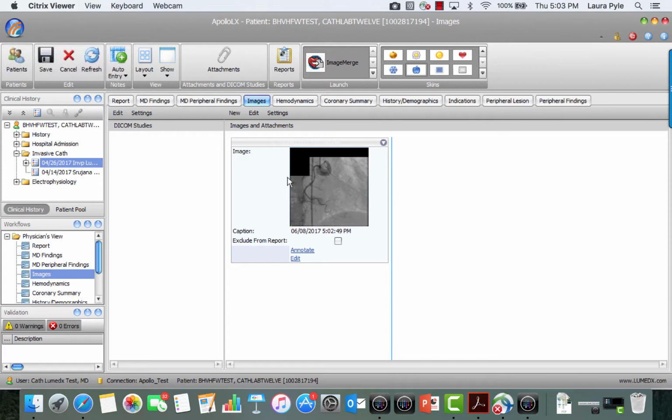As a note, any hemodynamic snapshots of pressure gradients taken during the procedure will automatically be included in the bottom of the procedure log report. DICOM or X-ray images that you have included as an attachment will be in the physician report.